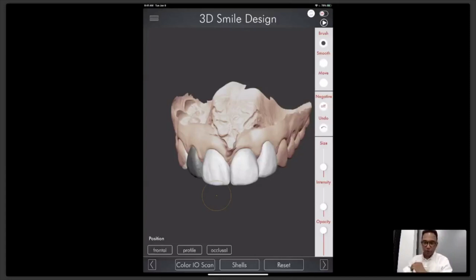Another question from Josué: what happens in a deviated dental midline? So for that, all the way back to the beginning, when you are looking for the facial flow concept, when you are creating the analysis of the orofacial, then you have to decide there if you want to create a new dental midline for that patient, or if you want to keep that dental midline.